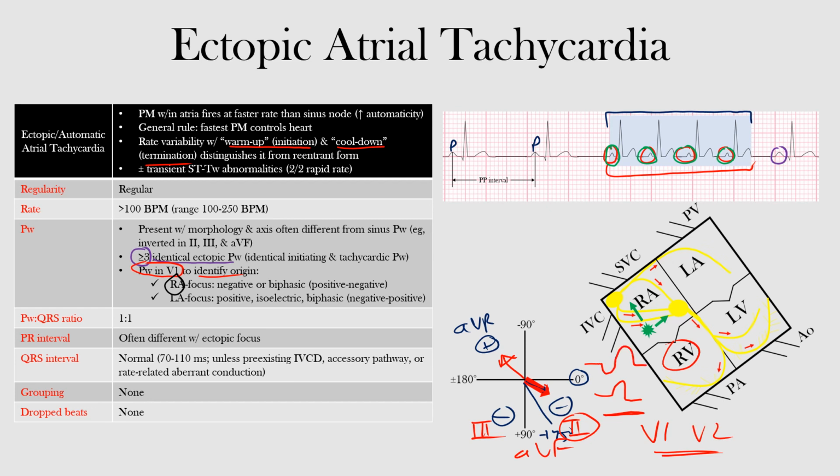And this is an abnormal P wave. We usually don't want it going like that, but it should make sense why that's the case, okay? Again, imagine one originating here in the left atrium, going backwards to depolarize the left atrium where it's originating from, so we'll get that negative deflection going down, and then it'll come forward and depolarize the right atrium, and because of that, as it heads towards lead V1, it will see an upright deflection, okay? So hopefully that makes sense. So what else do we have going on here?